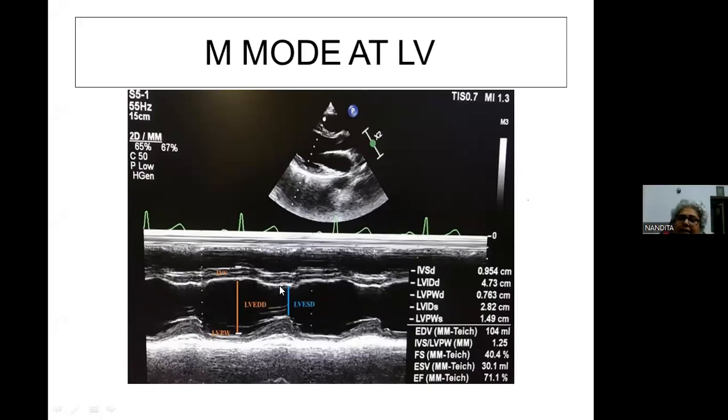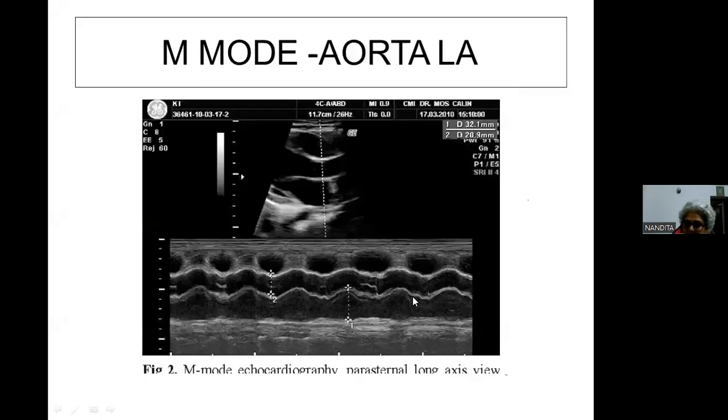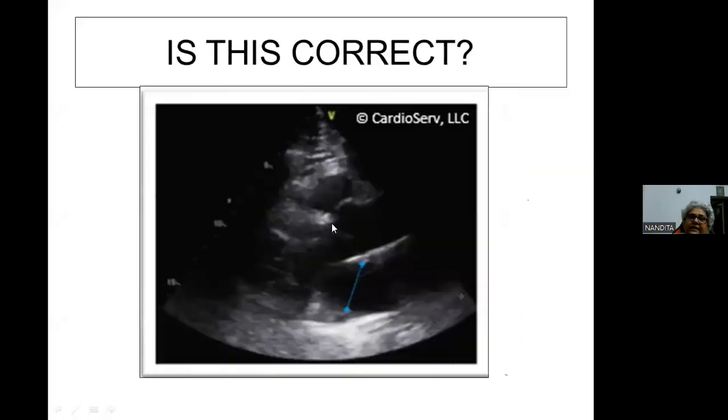No, that is a convention that you take the septum. We don't change conventions because everybody is working by conventions, right? For example, this convention of leading edge and trailing edge. If you don't follow guidelines, if you don't follow conventions, then we will deviate. You will see this will correspond to the ECG of your end of T wave. Okay. So that's it.